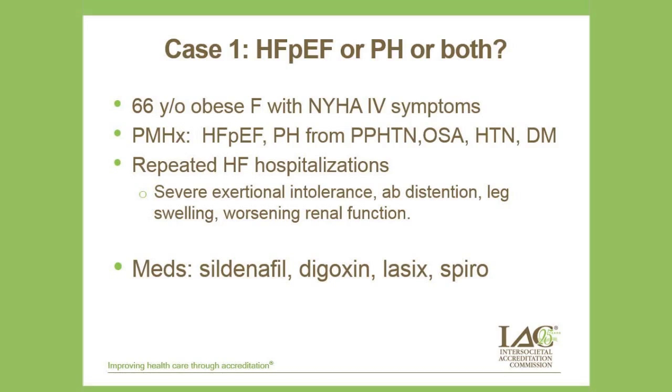Throughout her hospitalizations, volume status was felt to be difficult to determine, and diuresis was half-hearted because as they tried to diurese her, renal function would get worse. She's on sildenafil, digoxin, Lasix, and spironolactone when we saw her, and the following are her echocardiographic pictures.